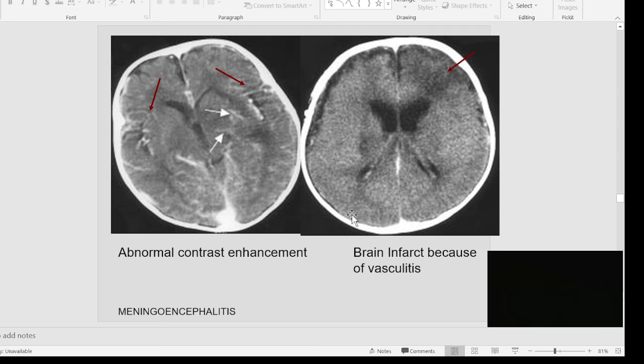Okay. So, na siya contrast enhancement. Makita? So, kani, muna yung appearance. So, kani nagamay yung mata diri. Tanaw na ito mas. So, nawala na. Okay, nikipos gud ni siya. No, nawala. So, this is another image, no? Kanay infarct. Kani. So, kung tanaw na ito, lahi ang ihang shades diri kaysa diri.